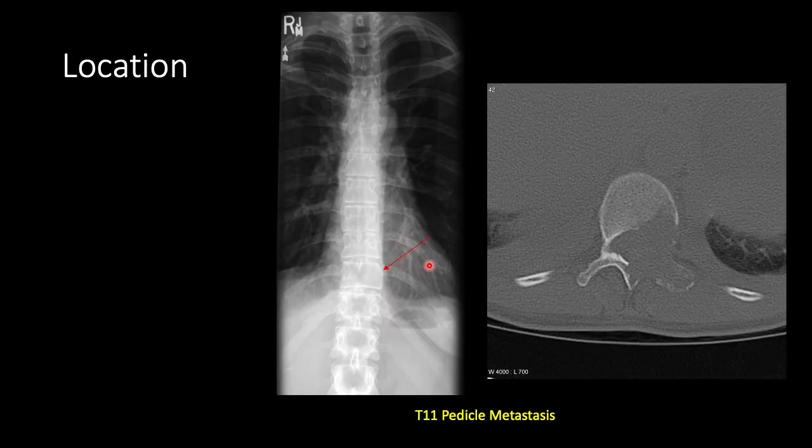Here's an example of the pedicle that I was talking about. In this case, you see a frontal radiograph of the thoracic spine. And you see these little circles on either side of the vertebral bodies. These are actually projections of the pedicles when you're looking at them en face. You can see they're bilateral and symmetric at every level here, but then you come down to this T11 vertebral body and you see the pedicle nicely over here, but you don't see one over here.